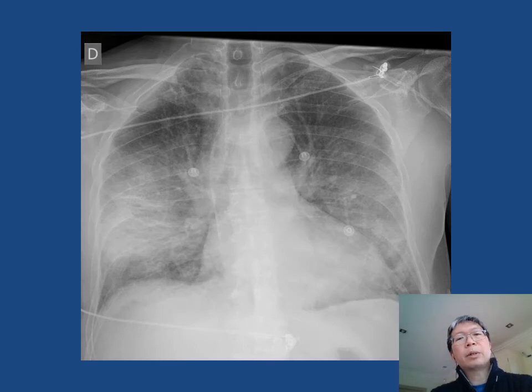This is a typical chest radiograph of a patient who has developed acute respiratory distress syndrome. On the film, you will see patchy bat wing and confluent opacification emanating from both hilar and sparing the costophrenic angles. This appearance can also be seen in patients presenting with acute pulmonary edema, although there are usually other ancillary findings on the chest radiograph.